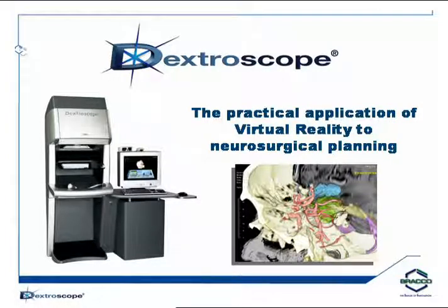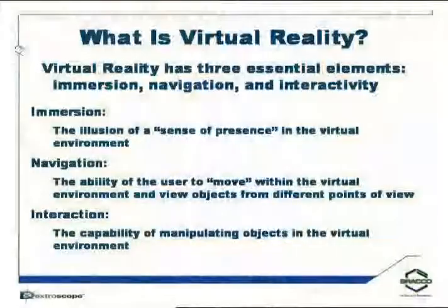And so you put on these active 3D shutter glasses, and you sit at this console, and you reach inside, which I'll show you in a minute, so that you're actually reaching inside to the space and manipulating the three-dimensional virtual objects. So you're looking at this mirror right here, and then you are able to see multimodality image fusion and three-dimensional stereoscopic images.